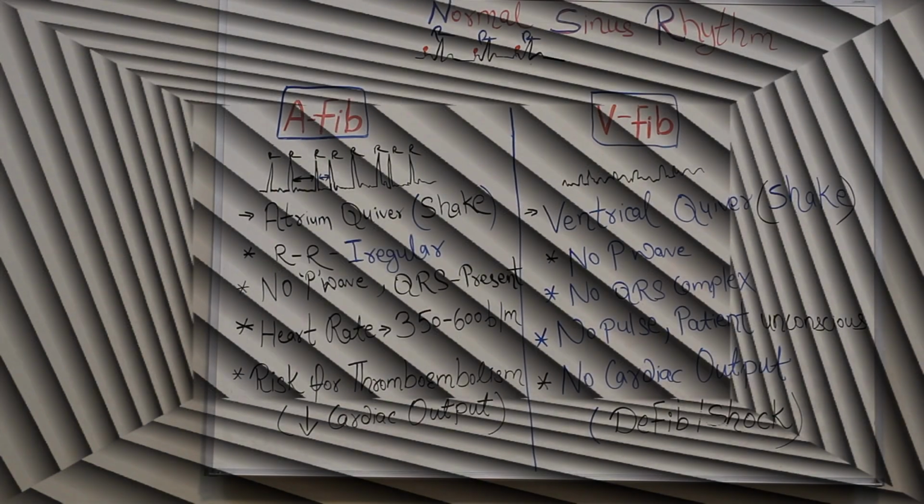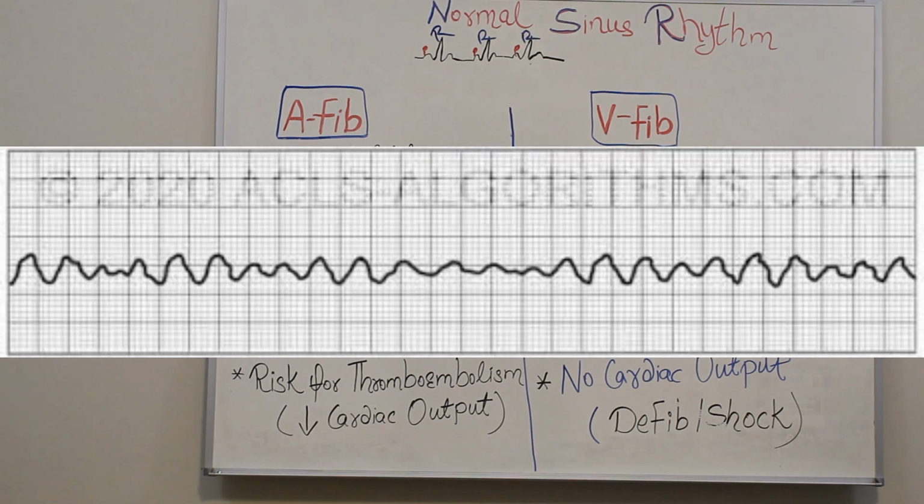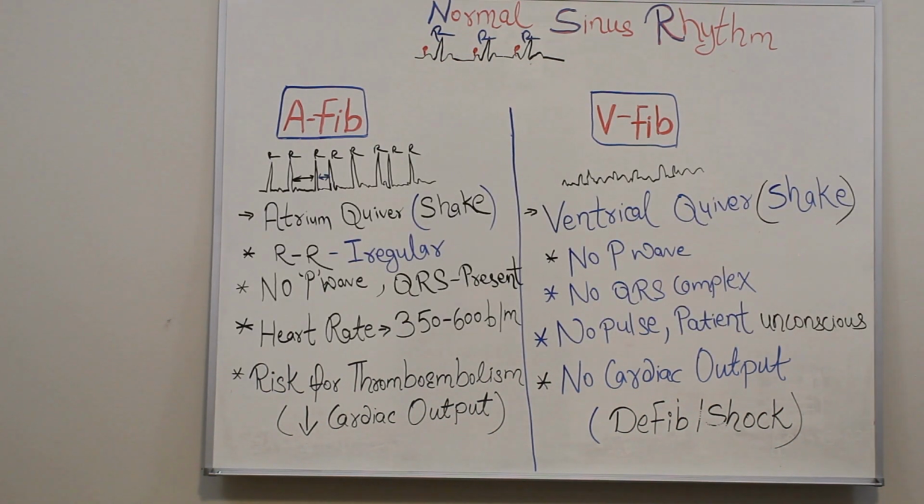In ventricular fibrillation, the ventricles of the heart are not contracting effectively, so there is a rapid, irregular and uncoordinated rhythm generating at the ventricles of the heart. We can see that the rhythm is very disorganized and it is a kind of wave-like form. And from the rhythm we can see that there is no P wave and there is no definite QRS complex.